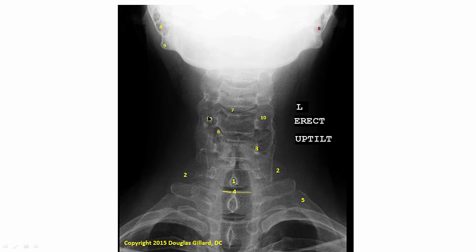Okay, so here the articular pillar would be here on C4. Okay, so you can see all the articular pillars. Spinous processes are harder to see, but there's one. Spinous process. Another one here. Another one here. So this one's a little easier. They kind of jut right out, right?